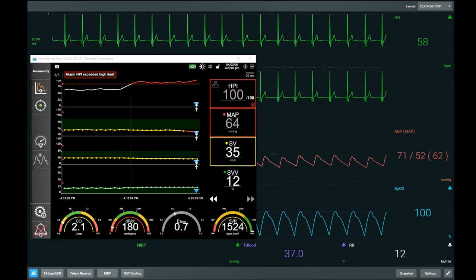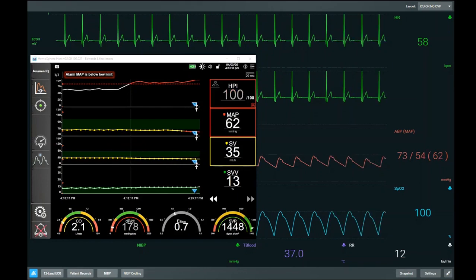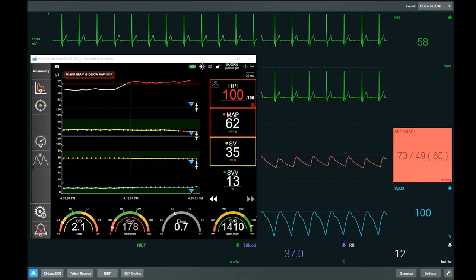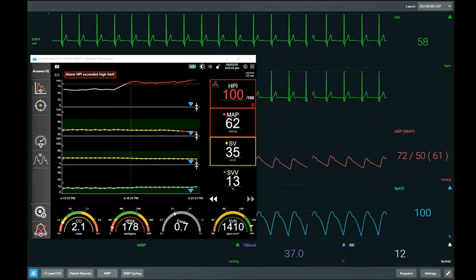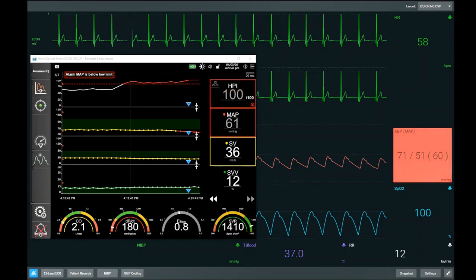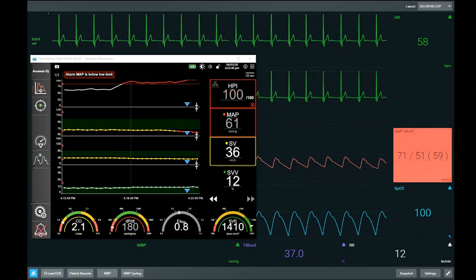Well, we have to go back and look at EA-dyne, and a proper description of EA-dyne is available in one of the other modules. But EA-dyne tells us if a patient who is preload responsive will increase their blood pressure to a fluid bolus. For that to be valid, there are 3 things that have to be true. First of all, you have to be hypotensive, which this patient is. Secondly, you have to be a preload responder, which this patient now is. The SVV is 13. But EA-dyne needs to be raised, and EA-dyne is not raised in this case, and we define raised as being greater than 1. So you know a priori that giving this individual fluid will improve their stroke volume because they were preload responsive, but it will not improve the blood pressure.